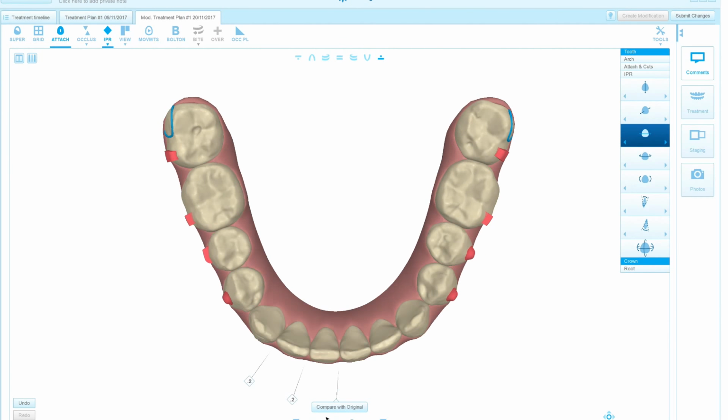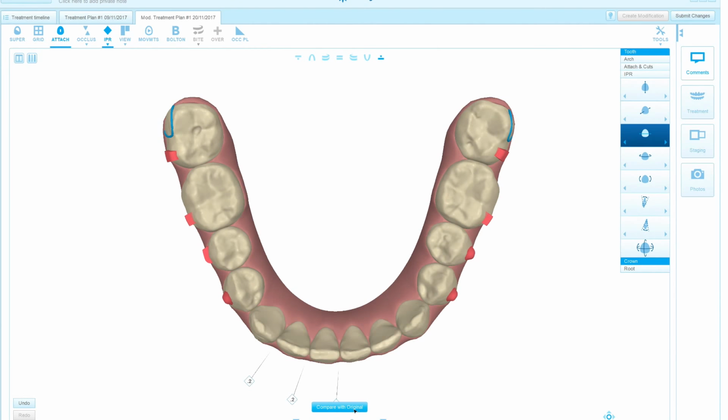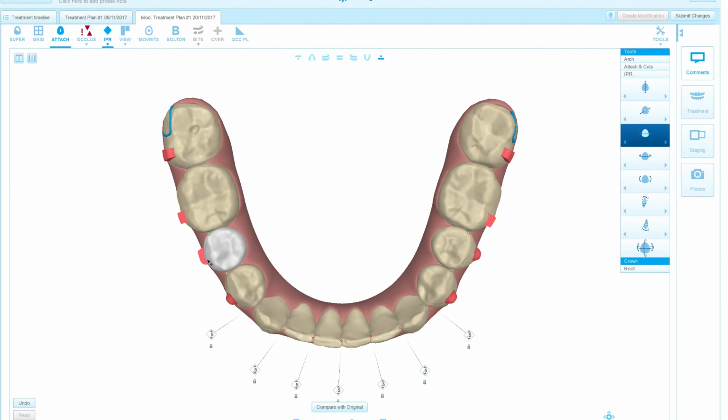You have a different one in the 45 because it's a little bit rotated, and instead of putting this optimized, they have put the horizontal gingival bevel. Okay, but the attachments that are going to work really well in our patients to apply the protocol of anterior intrusion and posterior extrusion are these ones here.